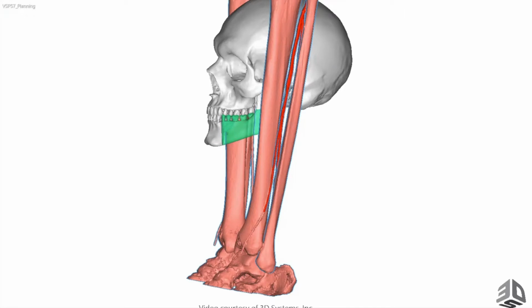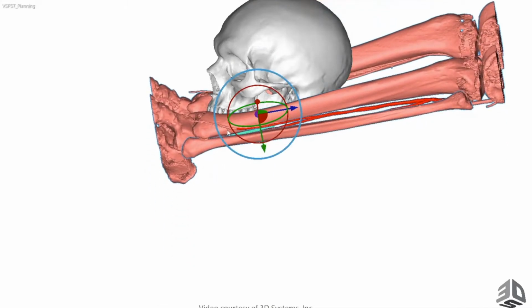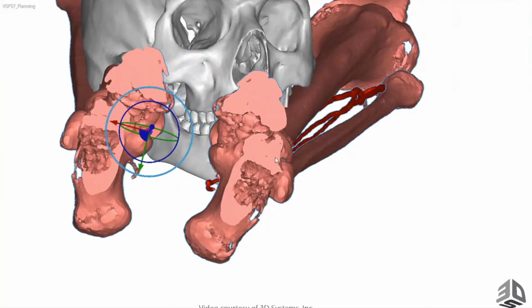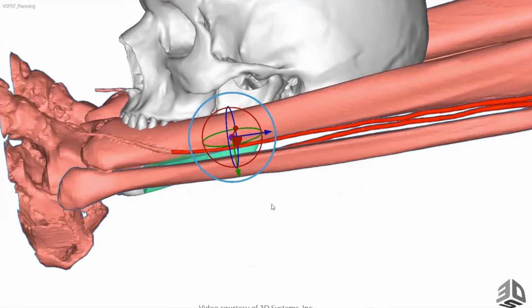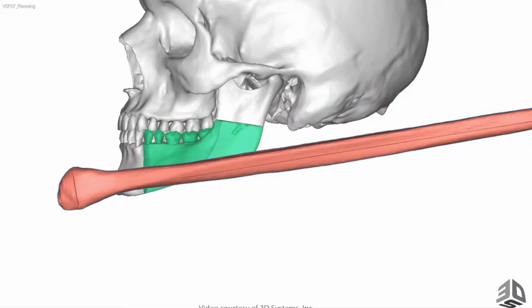So the reason we're using a left-sided fibula here is that the pedicle is going to come out the back. It's a virgin neck, but also I want the fascia and the skin to wrap around the plate and over the mandible into the neomandible covering, but not with a huge medial resection. So there's no big floor-of-mouth resection. And so in a thin leg, that's a nice way of wrapping the plate and the bone with the soft tissue, but you don't need a huge amount of soft tissue medially. So left side, please. Okay.